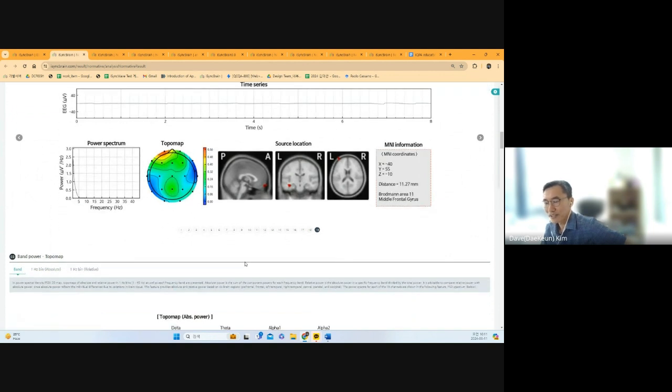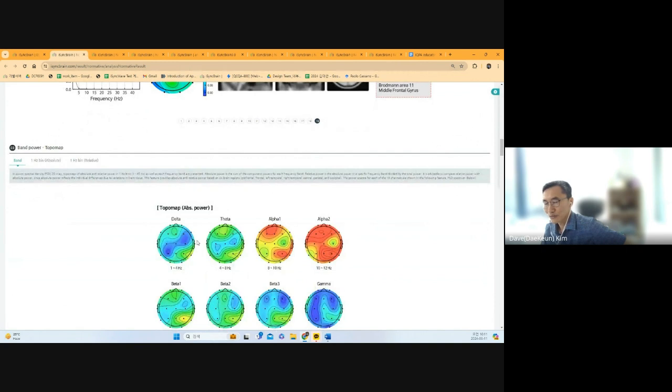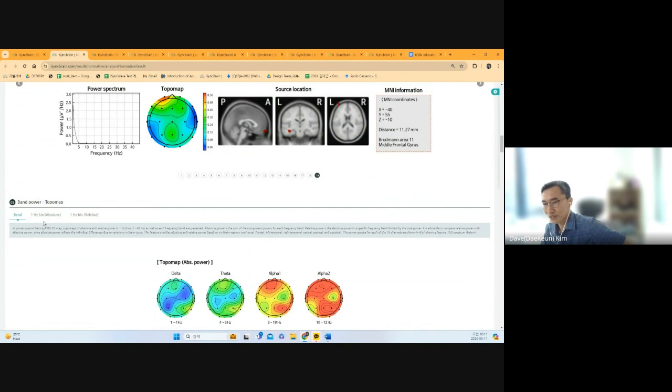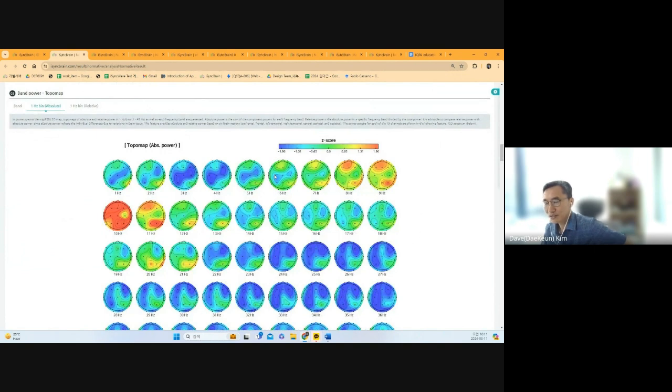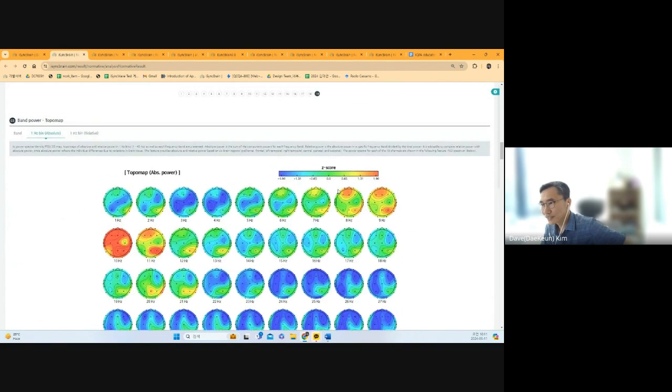temporal slow alpha activity. And also the frontal slow activity, you can find that in the 1 Hertz bin spectra. Here, there are slow alpha excess in the frontal and the right temporal excess in the 8 and 9 Hertz. We already saw the T6 amplitude is very large, and there is also excess in the frontal area.